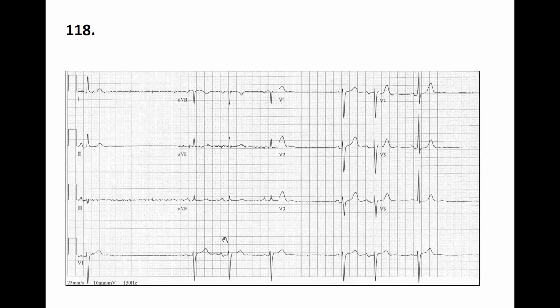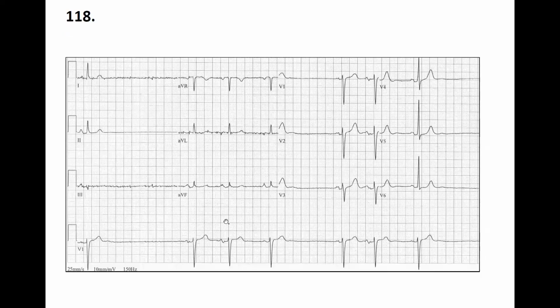118. Hello, that's me. Yeah, that's an interesting one. Yes, just before I start, I think I need to do this one quick because we have class in 14 minutes. So I saw an arrhythmia. So arrhythmia absoluta? No. No. You can see this arrhythmia absoluta, but somehow we do have some rhythmicity.